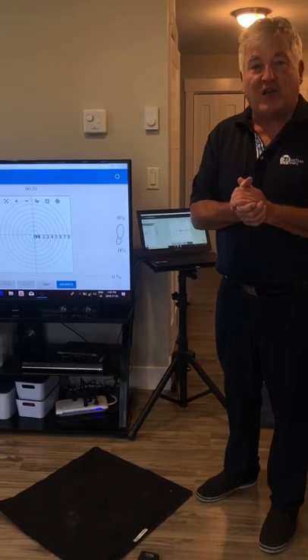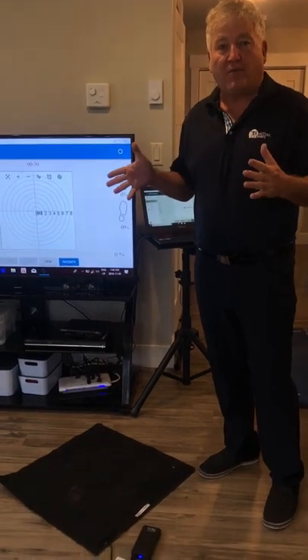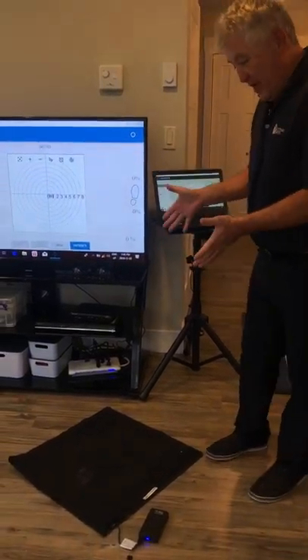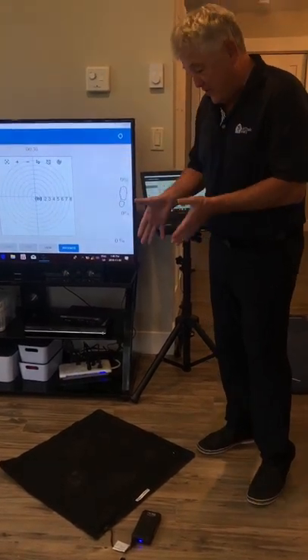Hello everybody, Terry Hashimoto here with the new BodiTrak Balance UI for medical applications. What you're going to see today is the new T10 chip in the BodiTrak pressure mat, the sensor.